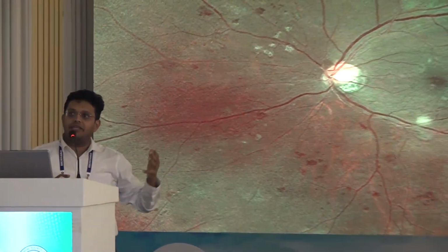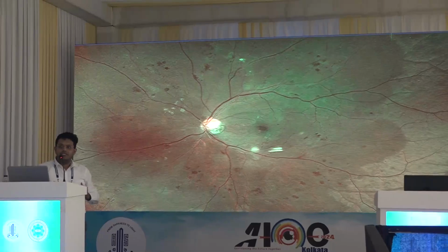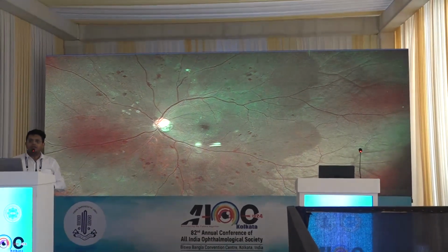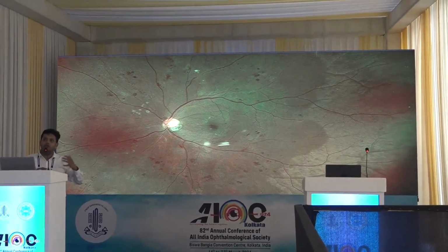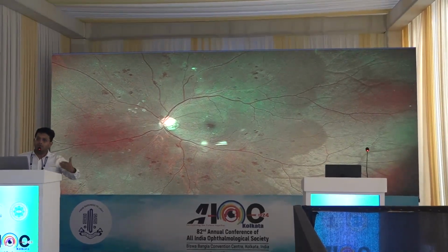it's very strange for an IC to be a houseful IC, and this is something which is very rare to be seen these days. Now let us look at this fundus photograph, and we all know that this is a case of diabetic retinopathy. Now we want to stage this diabetic retinopathy because your staging is very important, because if it's a proliferative disease, you want to end up treating this patient with a panretinal photocoagulation. But if it's a case of a severe non-proliferative disease where you don't have these abnormal new vessels which are developing, you tend to observe these patients.